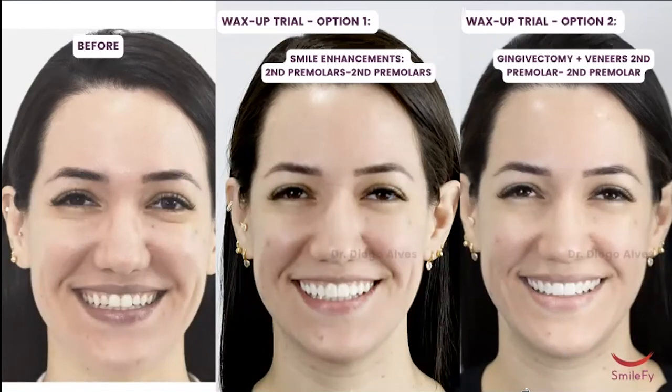Then, in-between appointments, where you do the 3D design, uploading the files into SmileFy, calibrating and performing the 3D design took about another 25 to 30 minutes. Exporting and 3D printing will depend on your machine. Here we used NextDent, so it took us about 30 minutes to print both models.